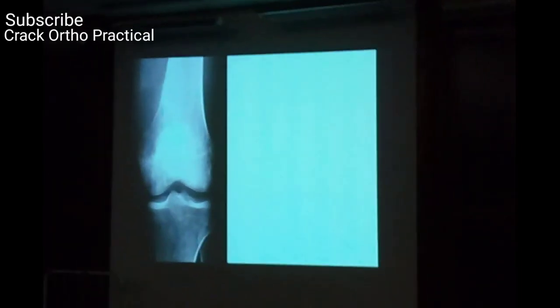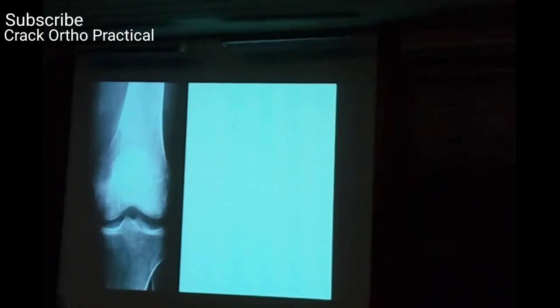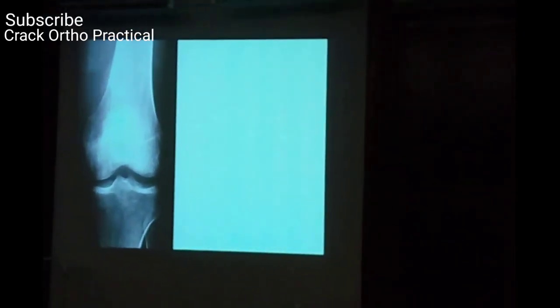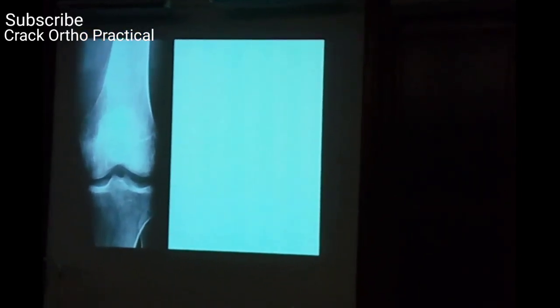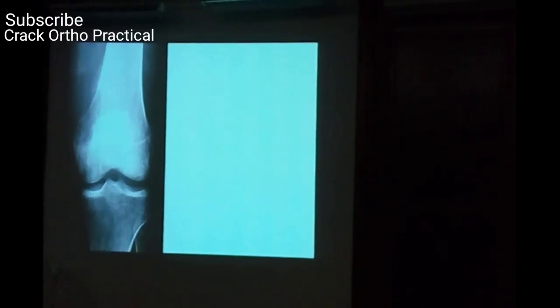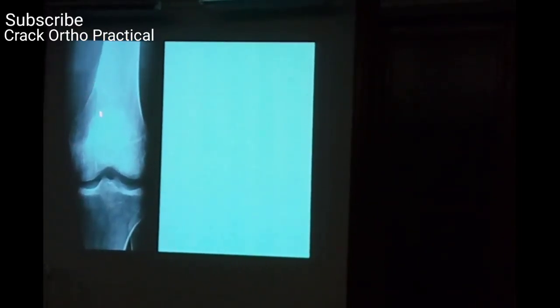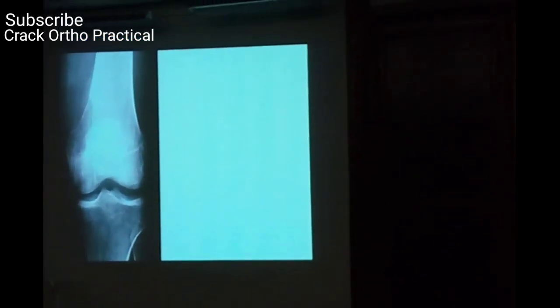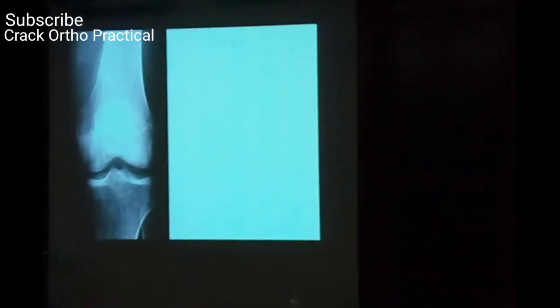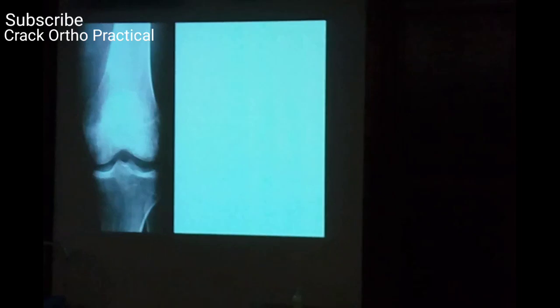Next. X-ray of the knee showing distal femur and proximal tibia, AP view, with a blastic lesion, epiphyseal metaphyseal. Blastic lesion? Lytic lesion, okay, in a metaphysis, which is eccentric. Okay. So, GCT. Anybody else?